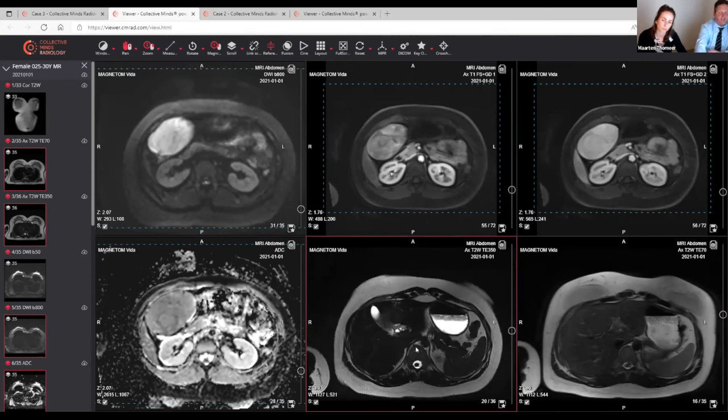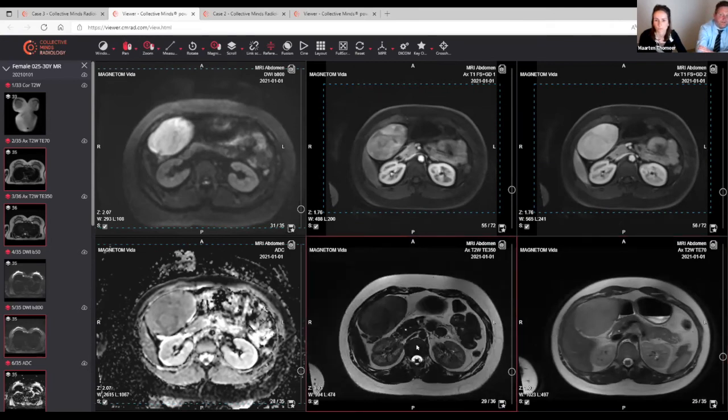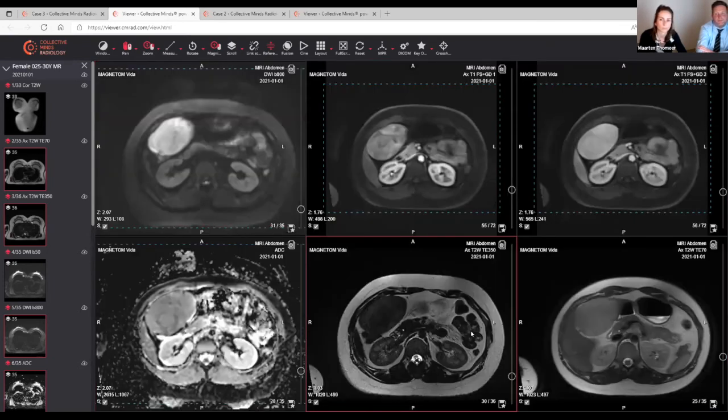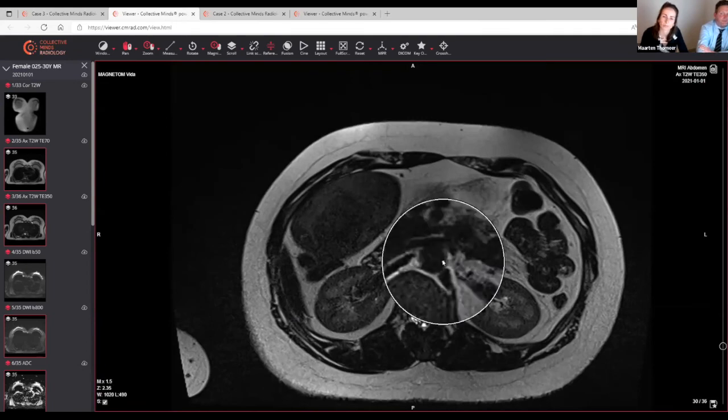If you look here, the lesion again is hyperintense on T2, and in the longer echo time, I don't know if you see it, but there is a nodule in nodule here, and there's also a dark region here, which is quite heterogeneous. So this is probably a region where there's less water, and here also. Because on the longer echo time, you will mainly see water.